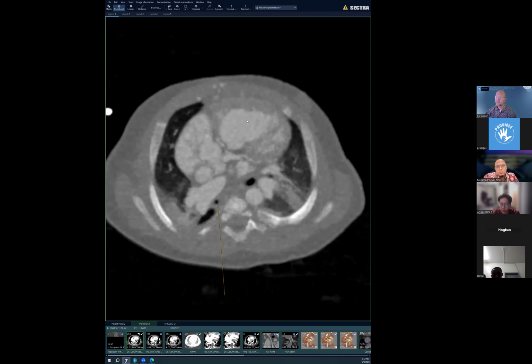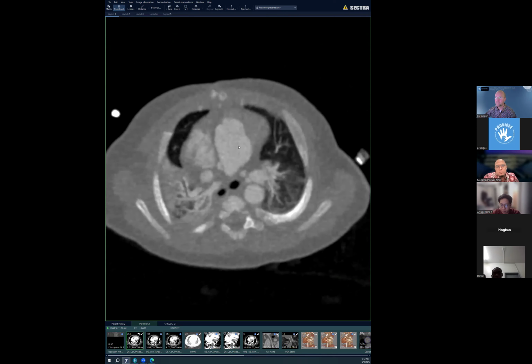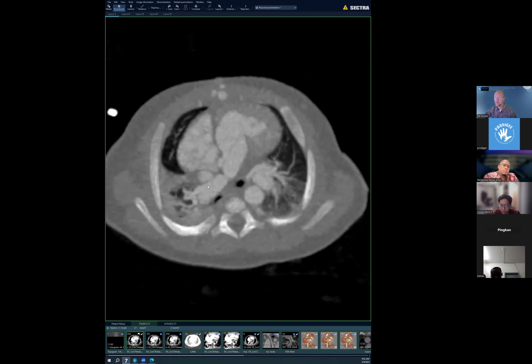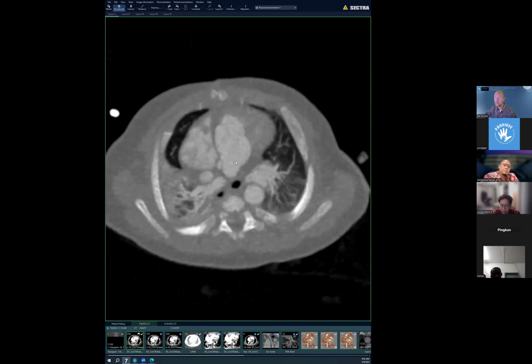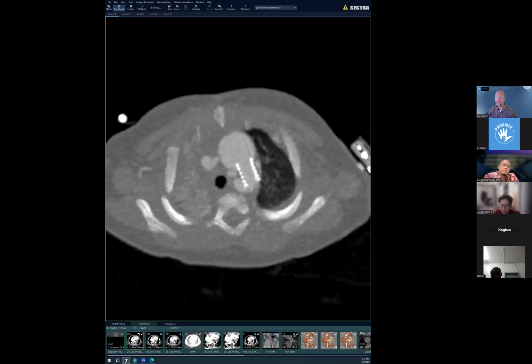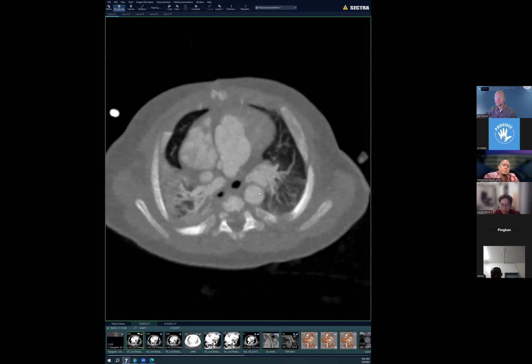dilated right ventricle, which is the only ventricle, so functionally a single ventricle that pumps into this giant pulmonary artery, main pulmonary artery, that then has rightward and leftward pulmonary arterial branches, and also provides flow through this stented PDA, the still patent ductus arteriosus, to the systemic circulation, to the descending aorta.